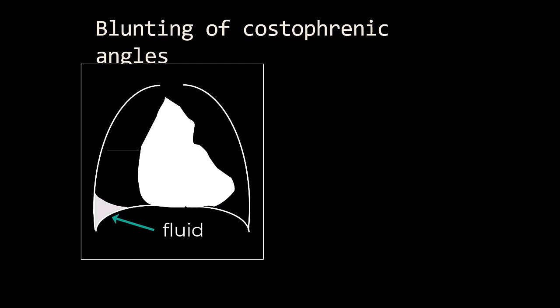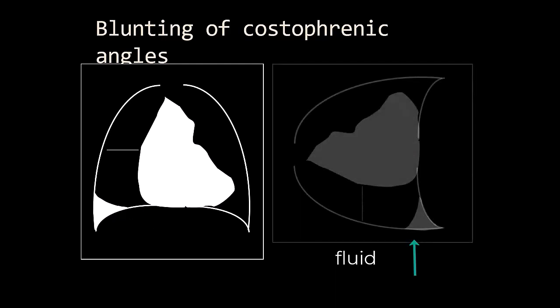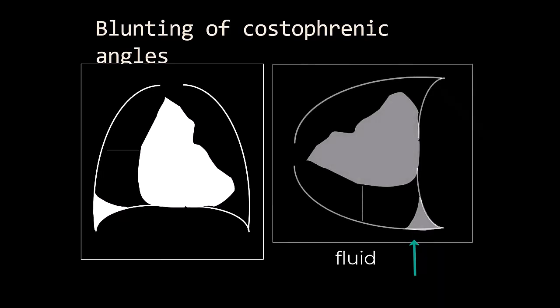You always want to make sure to have the diaphragm and costophrenic angles shown on your chest x-rays. This illustration shows a lateral decubitus. Notice also on the lateral decubitus view that the downside costophrenic angle is filled with fluid because air rises and fluids fall.